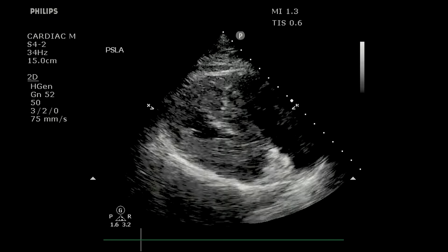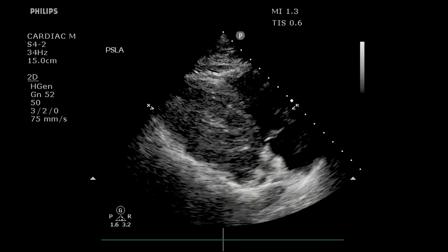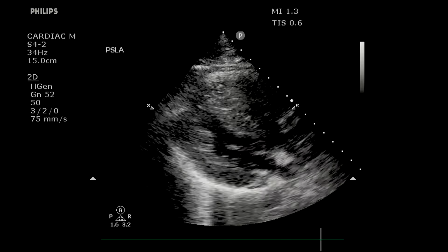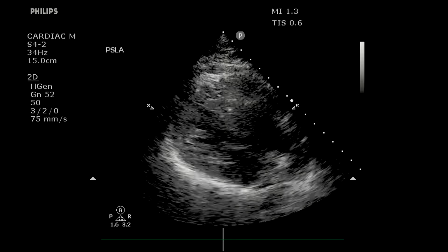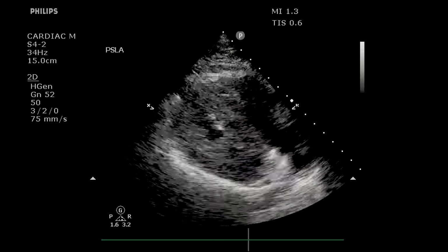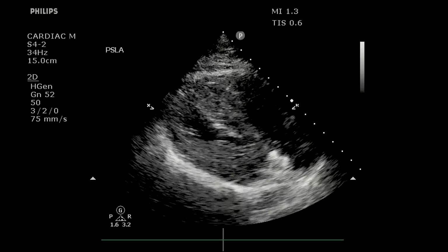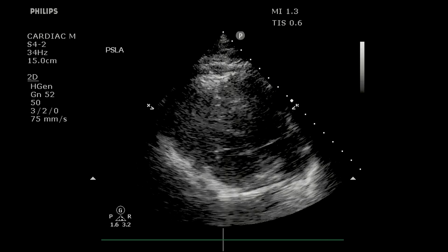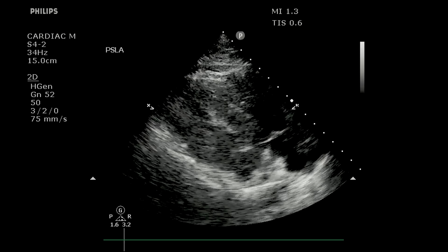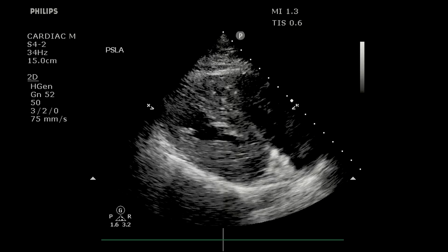The next one that I just alluded to is hypovolemia, and these can be challenging. So here's an example of basically an LV that's not filling, right? And so I guess by definition, proportionally, every ejection is squeezing a large amount of blood out. But is it just that the patient's super duper hypovolemic, or are they that good at doing what they do? And so again, these can be challenging, especially if the patient has a known history of something like mildly reduced ejection or moderately reduced ejection fraction, and then also have a hypovolemic event.